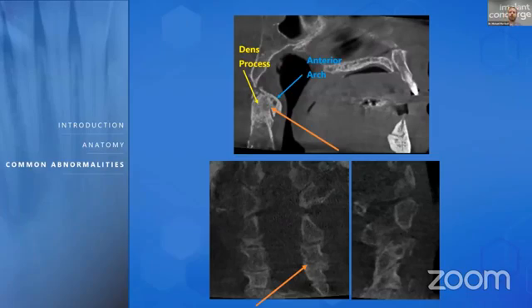So the main findings when you're looking at the TMJ, when you're looking at the condyles, again, it's important for me to repeat myself because it is the way that you look at it and you describe it. Most of the time, you're going to be able to get a good description by using basically a template. So the condylar heads are normal in shape and size. There's a thin and continuous cortical outline. That's very, very key because if there are interruptions or irregularities, you have something abnormal. It's no longer a variation of normal. Now it's something that potentially is pathosis, and that being remodeling. That would be your degenerative joint disease.